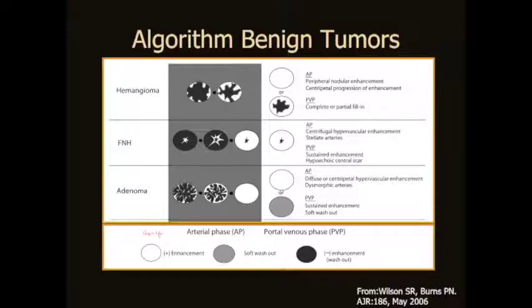Now, we always go on to image the lesions further because we must confirm what the lesion does for confirmation by showing its enhancement in the portal venous phase. And you can see there that those white circles almost completely covering every lesion. And of course, there's one small gray box at the bottom for adenoma. And what's the importance of that? Well, there are always exceptions in all the rules we set for ourselves.